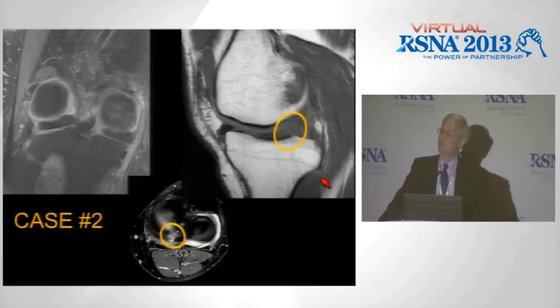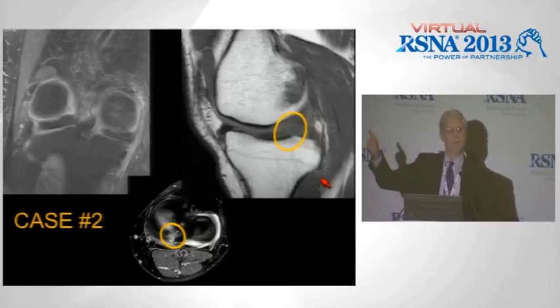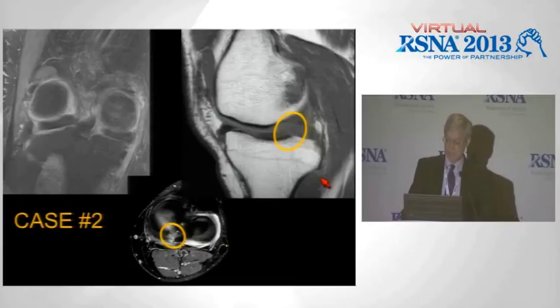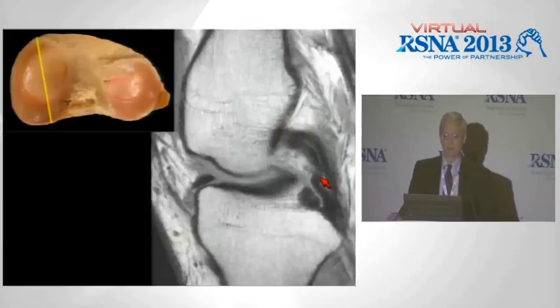How excited are orthopedic surgeons to do a posterior portal? What's back posteriorly? Big red, big blue, and big nerve, right? So there are more complications to posterior portals. So it's important because it may change how your surgeon addresses this tear, and it may have dramatic implications as well.